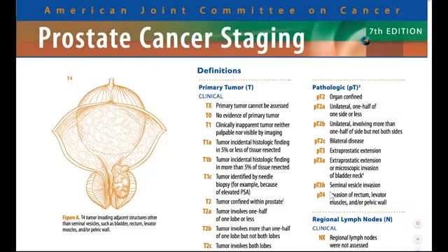Let's evaluate prostate cancer T staging. I'd like to make three major points. First, the very early stages do not have an imaging correlate. Second, let's highlight where MRI is at its best in T staging. And third, let's develop a somewhat systematic practical approach to evaluating when the T stage becomes significant and disease extends outside of the prostate. So let's begin with the early T stages.